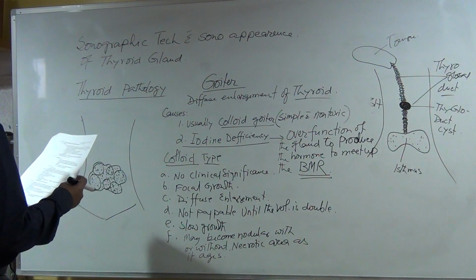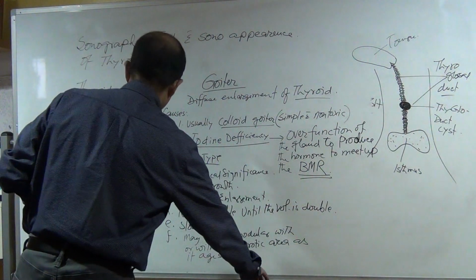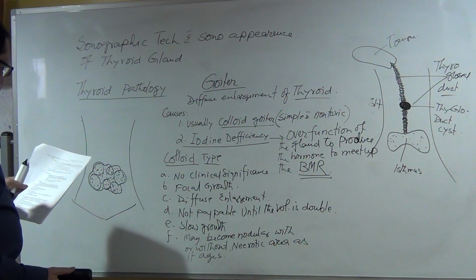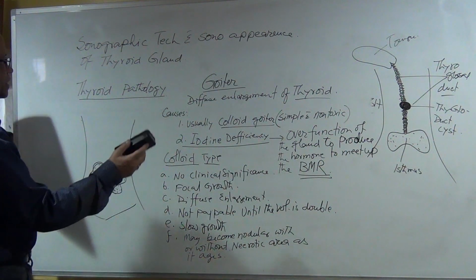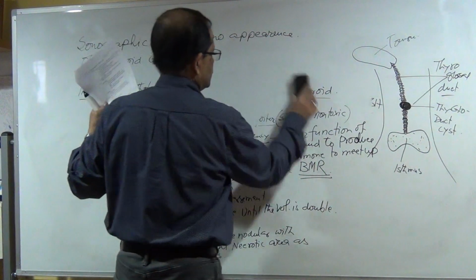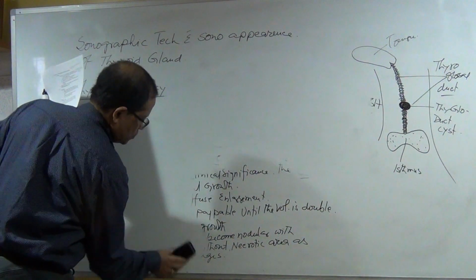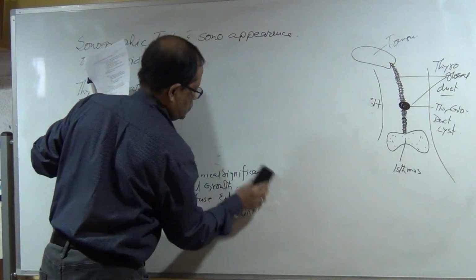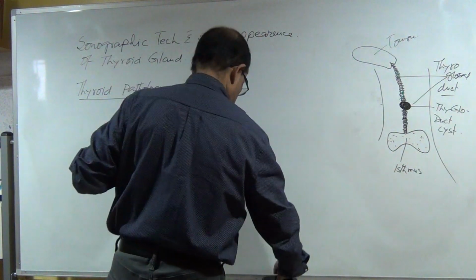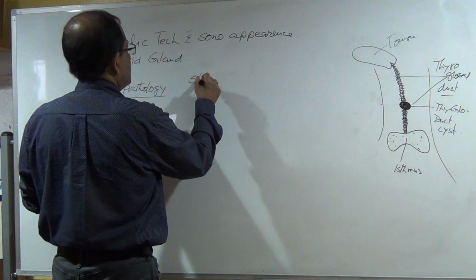Now I will go over the sonographic appearance of goiter.